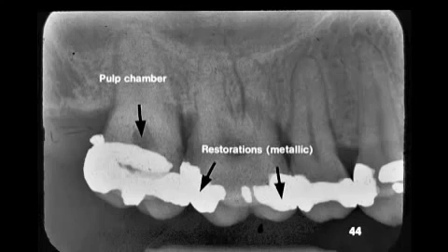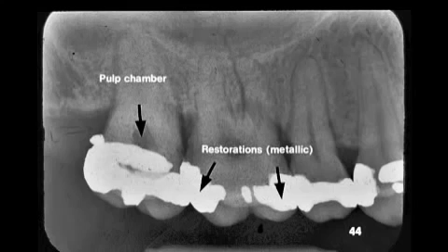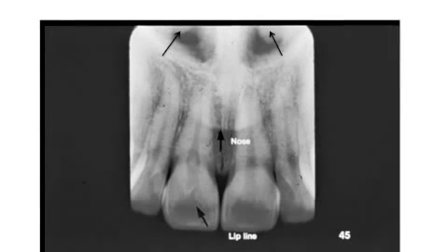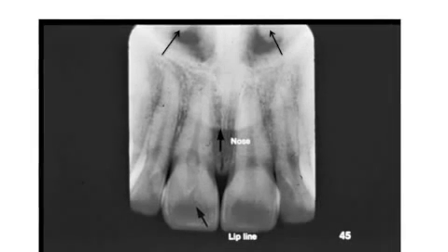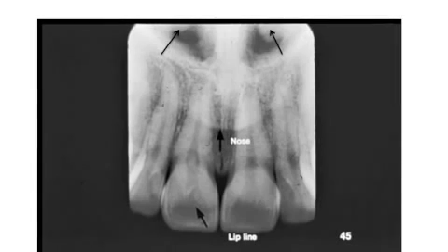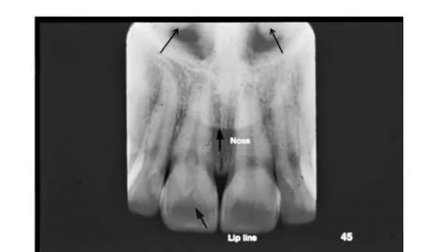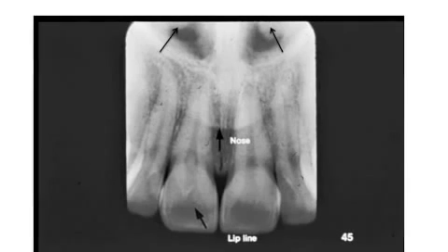The arrow to your left points to the pulp chamber. It is radiolucent. Areas that the other arrows point to are amalgam, radiopaque metal fillings in the tooth structure. The upper arrow points to radiopacities of thin shell-like bones, the inferior nasal concha, inside the radiolucent nasal fossa.